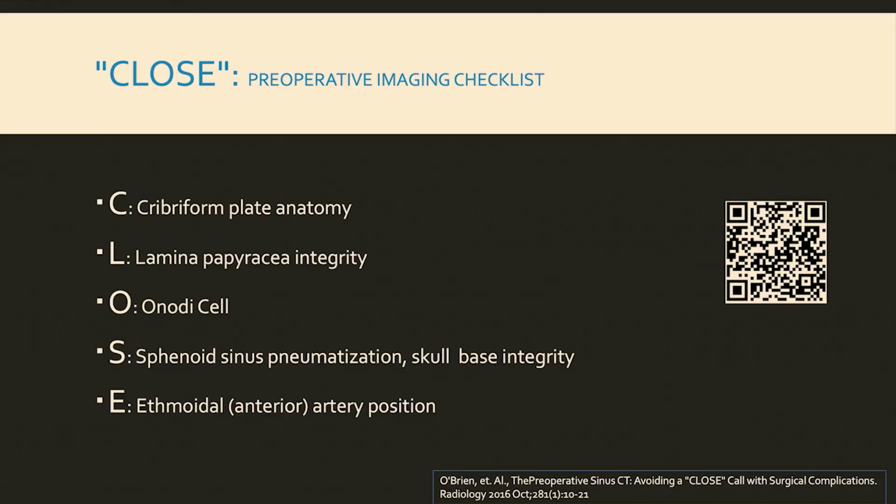Okay, so this is like the crux of this. I want to go through this CLOSE acronym. I literally, guys, have this acronym in my sinus template, so I know that I'm dictating everything that's important, every critical anatomic variant for my sinus CTs.